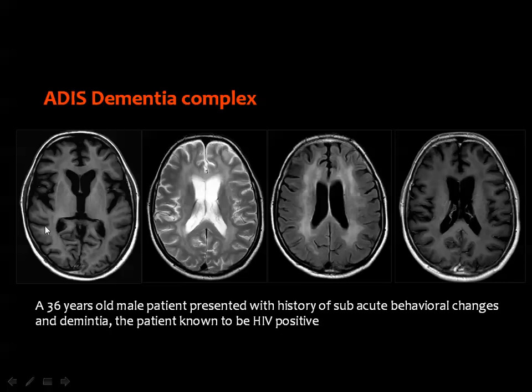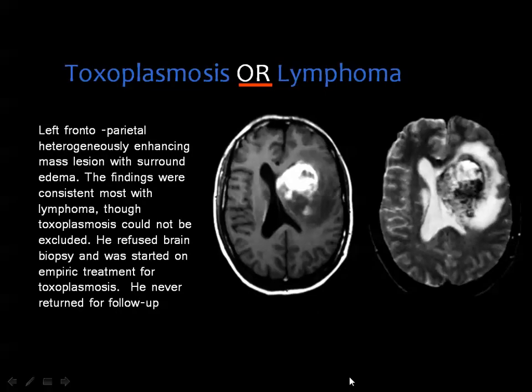And you can see this brain for a patient 36 years old, which you can see this appearance in a patient over 60, for example, with dilated ventricles, dilated extraaxial CSF spaces, sheets of abnormal white matter signal around the ventricles due to ischemic changes or due to the effect of the virus on the vessels or the white matter. And after you inject contrast media, you got no enhancement.